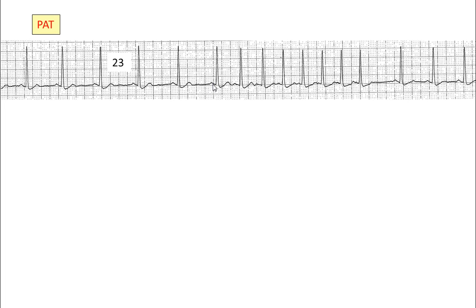All right, right here is the last slow beat, quote unquote, and then this next P is the one that just jumps out at you, and really he almost doubles his heart rate right at this beat. There are 7 beats in this run. Every single one of them starts with a P wave. Here's the second P wave, the third wave, fourth P wave.